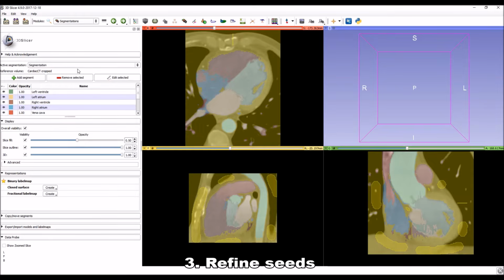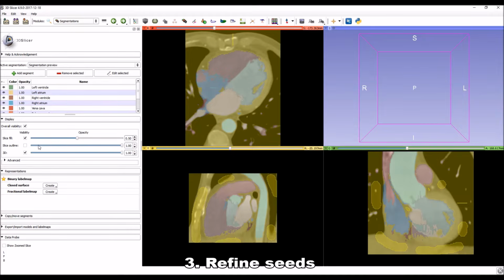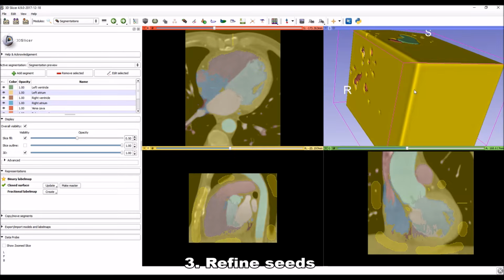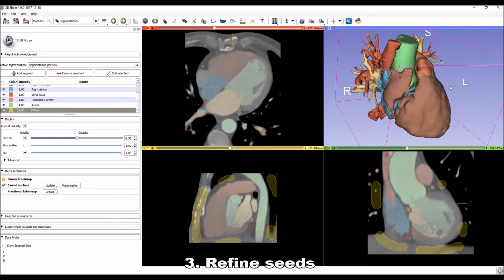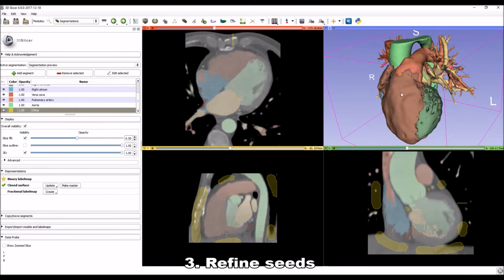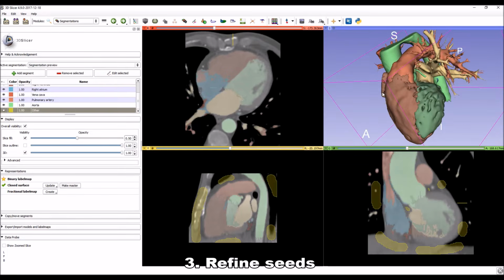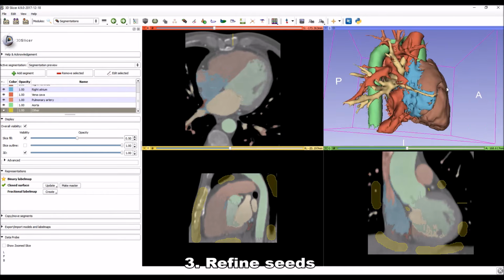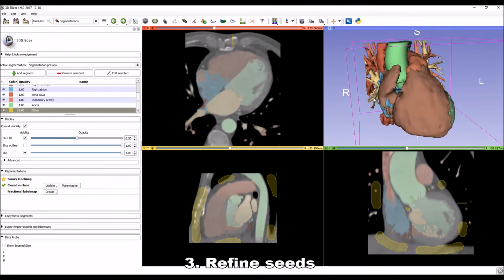So I go to Segmentations and I choose the segmentation preview, and choose to show it as a closed surface in 3D. I click this button to recenter the view. Of course the other segment hides everything, so I just hide this so that we can see the automatic segmentation result. It's more or less okay, except there are a couple of places where the seeds are not propagated properly, at the boundary that may not be fully correct.